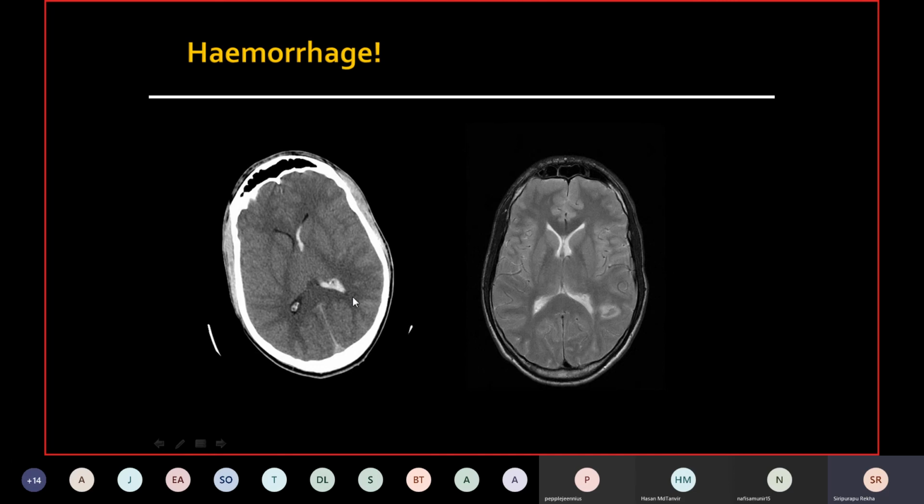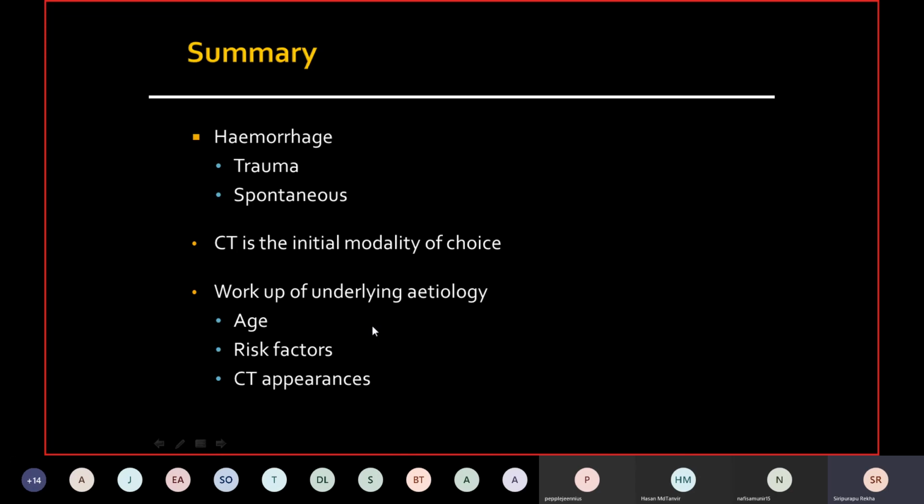This patient, we then asked for the CT to be done because the imaging looked suspicious. You can actually see very easily that there is hemorrhage. All I'm trying to show here with these two cases is that hemorrhage on MR is a difficult thing to pick up, whereas it's so much easier on CT to identify hemorrhage.